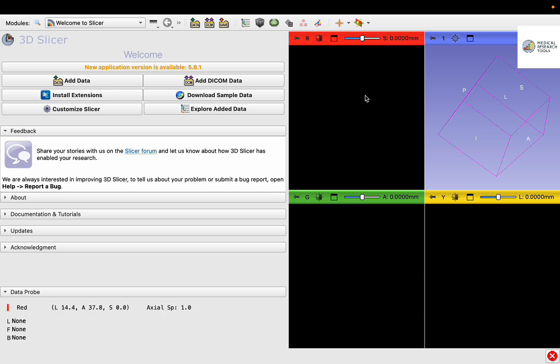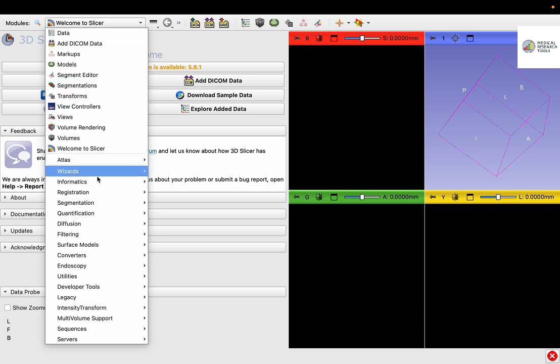And you can manage to evaluate your imaging from different aspects. And on the other part, we have a lot of sections and details. Don't worry if it looks a little complicated, but I will show you how to use each part. This first section is the home screen where you can load your cases. And on this list, we have a lot of sections that we are gonna learn about.